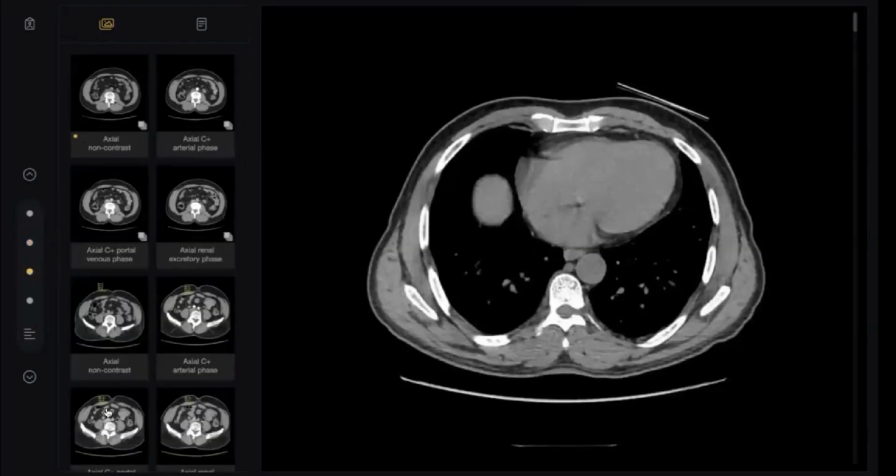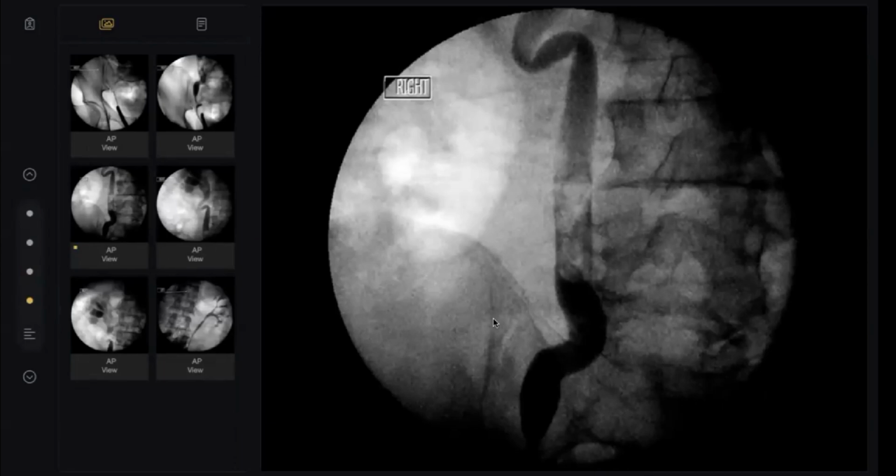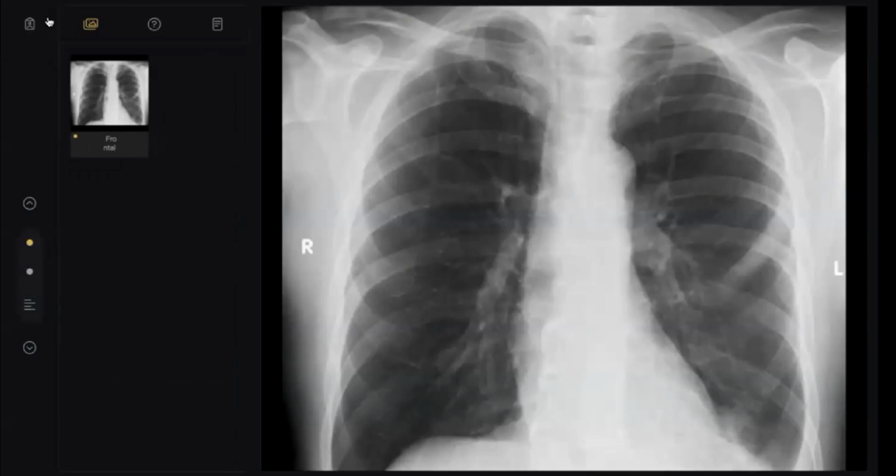And then the CT shows us here. My colleague, I have been presented with many static images in the exam, and the pathology was very clear. Anyway, finally we diagnose this as an ascending ureterography. I think this is done by endoscopy, cystoscopy. Thank you so much, my doctor. Next candidate.